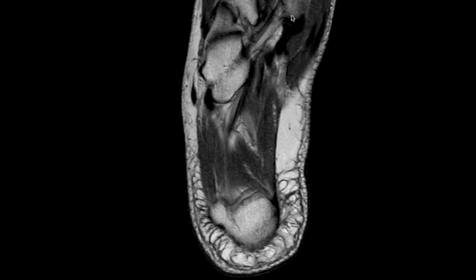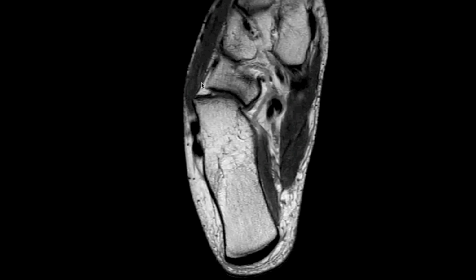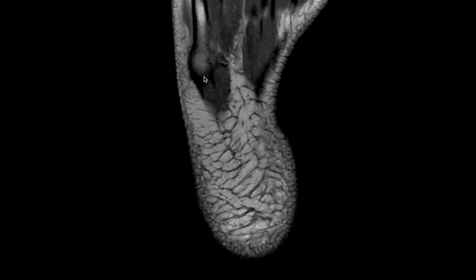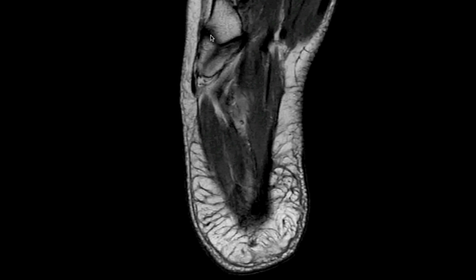So we covered that first metatarsal as an important landmark for attachment of the peroneus longus. We talked about the base of the fifth metatarsal and its tuberosity as important sites of attachment of the peroneus brevis, as well as the lateral cord of the plantar fascia, and occasionally dorsally we'll see the peroneus tertius.